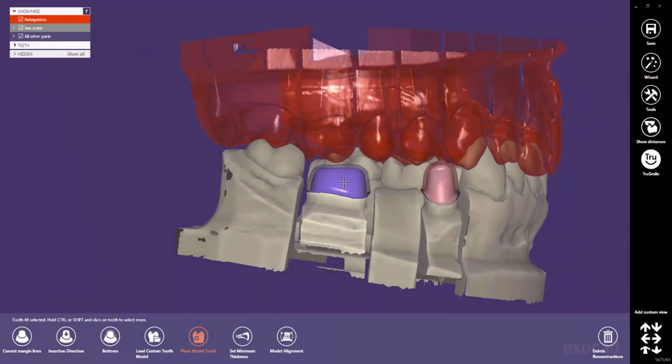The toolbar guides you in the Expert mode. It only shows the available work steps in a logical order. The list will become more populated as you proceed with the design. Additionally, the work step the wizard would restart with is colored in orange.